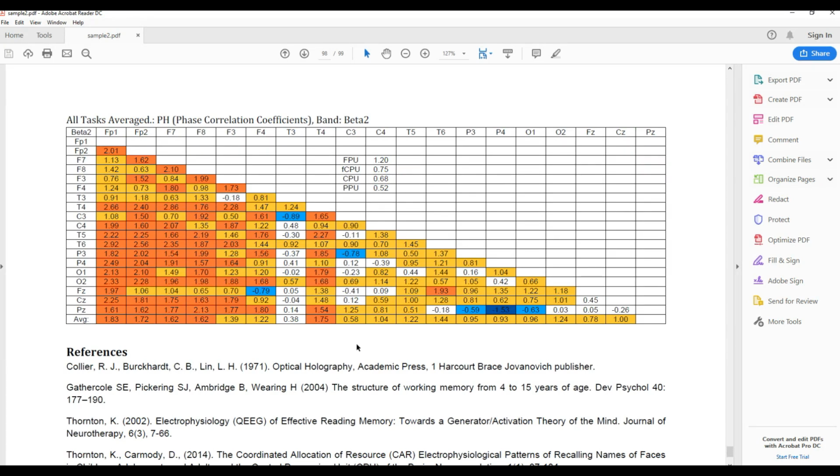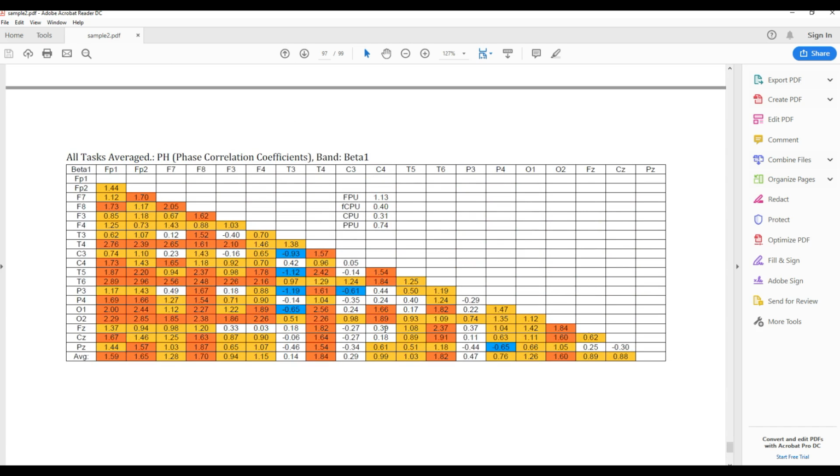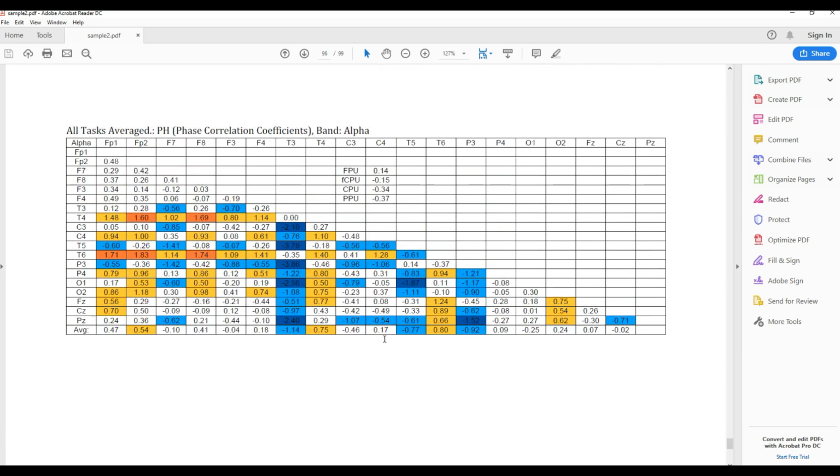So for this example, we have a relative problem at T3, phase beta 2. And if we go up, we can see that the T3 problem relative to the other values also remains weak. And we also have C3 as well as P3, all left hemisphere locations. And then we go up to the alpha frequency. We're in phase again, and now we see a particular problem with T3 phase alpha. You can see the many blues and where the connection problems are occurring, mostly to the left posterior region, the dark blues indicated. But you can see some other problems beginning to show up.